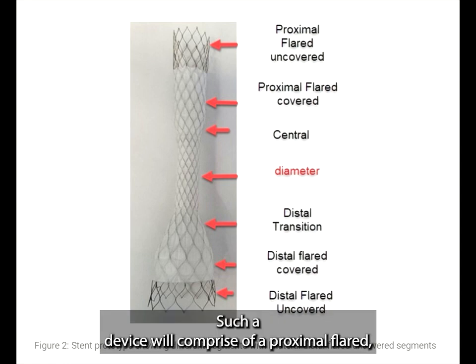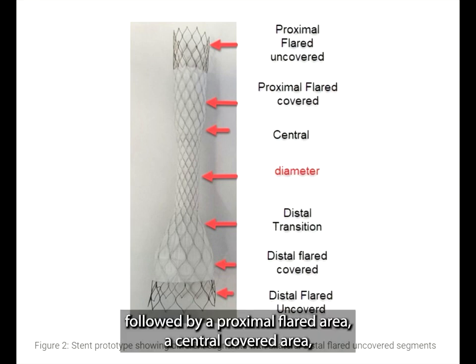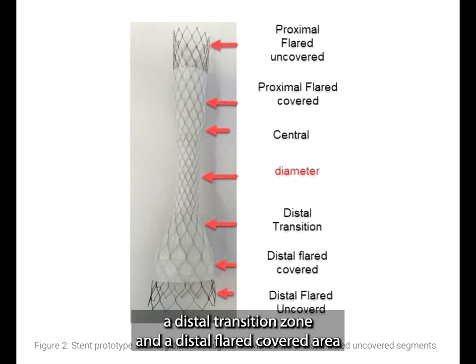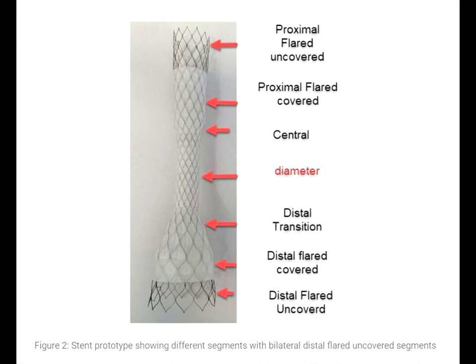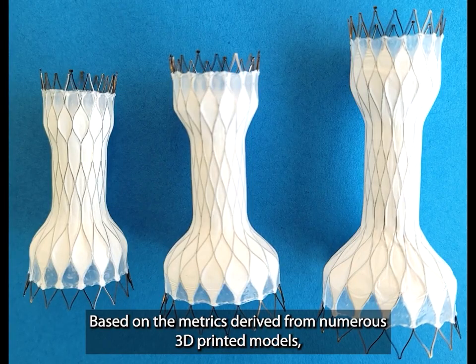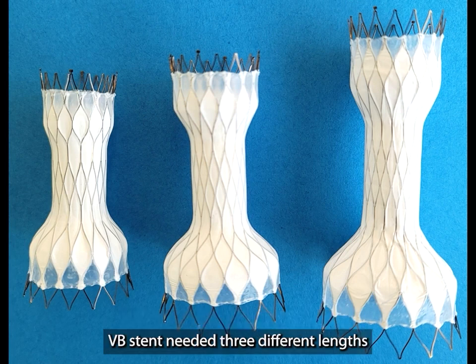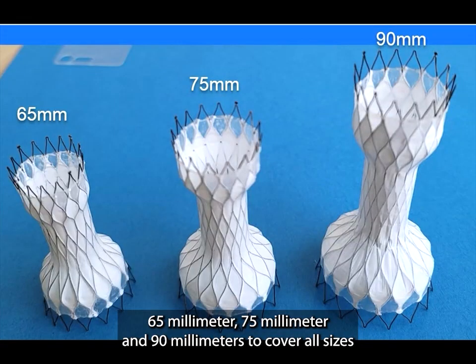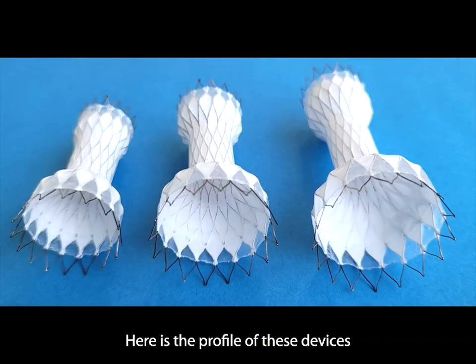Such a device will comprise a proximal flared uncovered area to anchor the device to the SVC innominate junction, followed by a proximal transition zone, a central covered area, a distal transition zone, and a distal flared covered area. Based on the metrics derived from numerous 3D printed models, the final device configuration of a transcatheter device, the VB stent, needed 3 different lengths, 65 mm, 75 mm, and 90 mm, to cover all sizes of patients. Here is the profile of these devices from various angles.